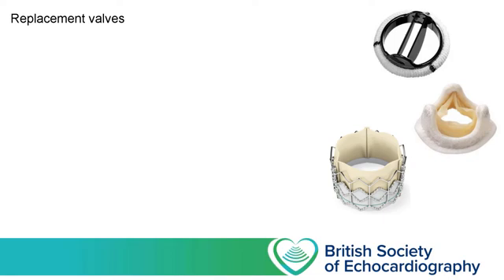Whilst replacement valves are not the focus of this lecture, I would like to show you a few examples of some of the common types that you will find in your practice, so at least you'll be able to recognise them when you see them.